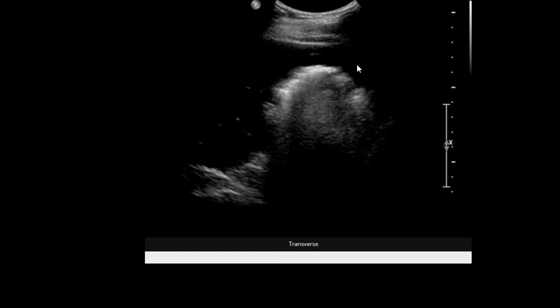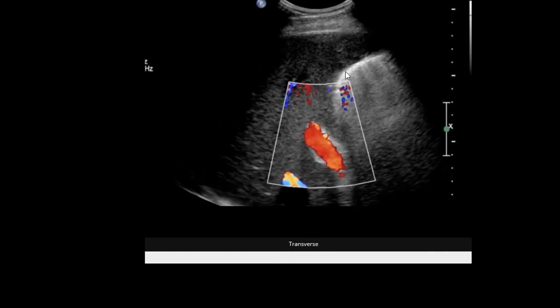And one more cholecystitis case. This is the gallbladder, and here we have some very bright echogenic material with some dirty shadowing appearing to be located along the gallbladder wall, or in this case within the gallbladder wall. And you can see it on a few views, and this is a case of emphysematous cholecystitis. So those are our cases for today.